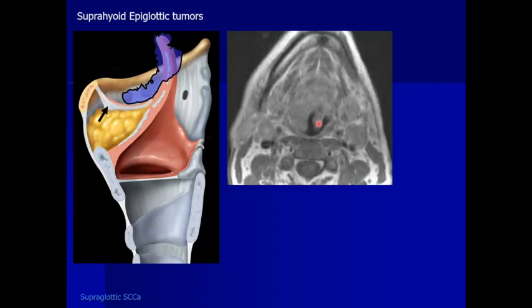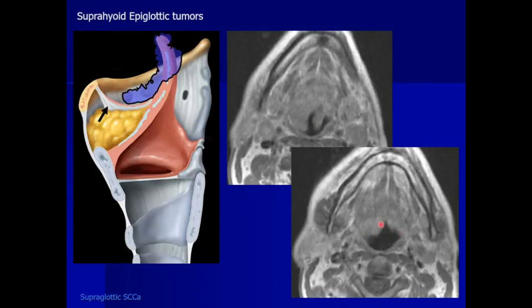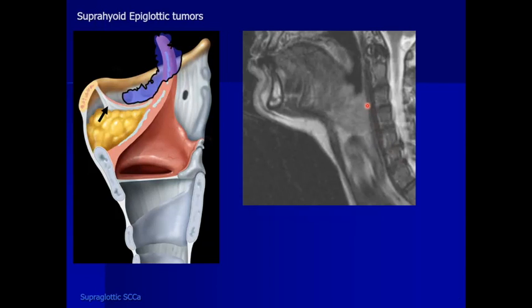So here's an example of a real patient that had diffuse thickening. This is tumor involving the whole suprahyoid epiglottis. And you look more north and you look at the base of tongue and you've got too much soft tissue on the right. So what happened here is the tumor started on the suprahyoid epiglottis. It went into the vallecula and went into the base of tongue. You can see that the hyoepiglottic ligament is intact, so no tumor went into the white pre-epiglottic fat.